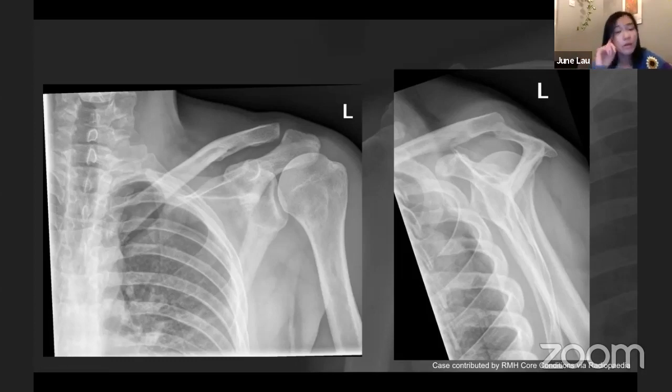Someone said rib. Okay. Oh, someone said pneumothorax. Yeah, exactly. Well done. I realize this might be slightly delayed, but well done. This is a pneumothorax. And I've drawn that blue line over there to show you you've got lung markings down here, but a distinct lack of lung markings here.